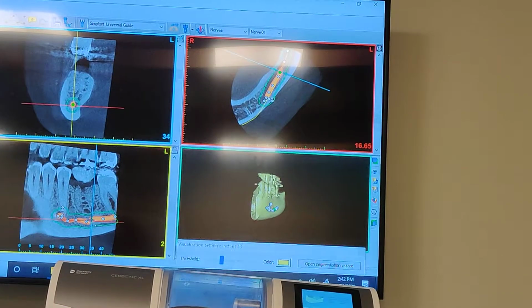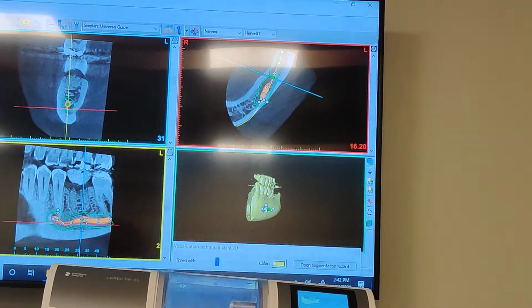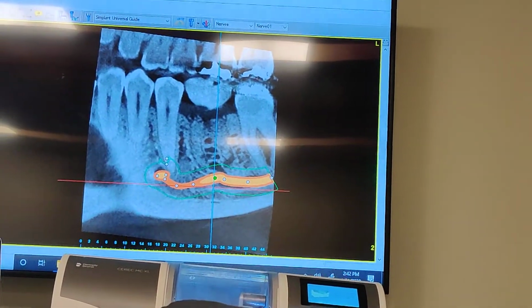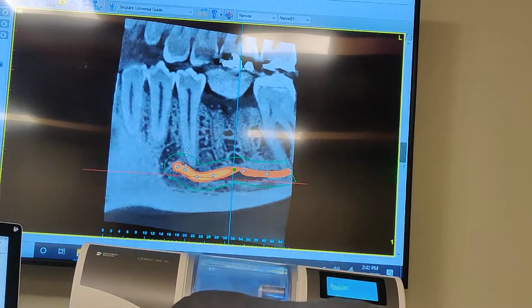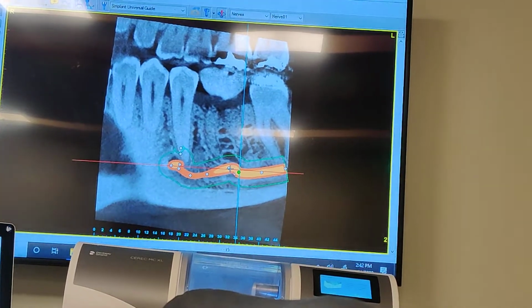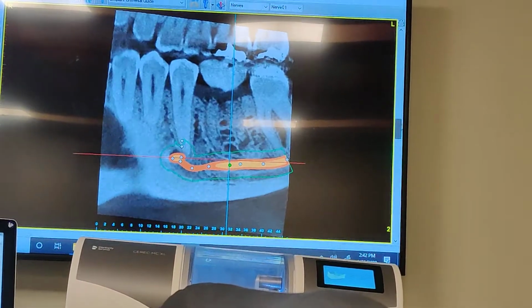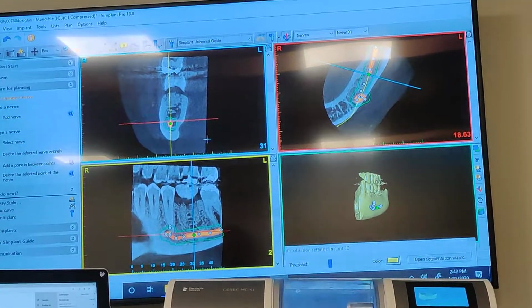Look, I come up here and I pull this up and I pull this up, and again I can make this window bigger, so I can get these. If you think my nerves are in the right place, I'm not going to get anywhere close to it, but I can readjust it. Everybody see that? Now I overdid it, so let's bring it back down. By just pointing and holding and grabbing those little balls and moving it down. How amazing is that? Isn't that crazy? Okay, so the nerve's marked.